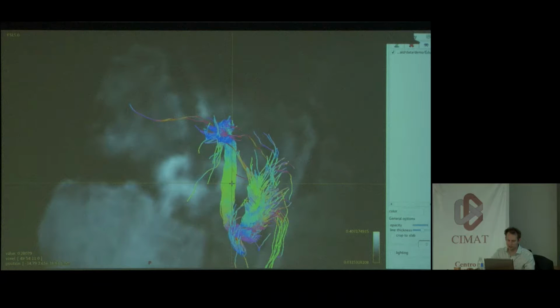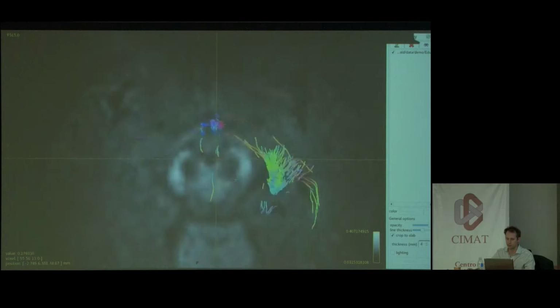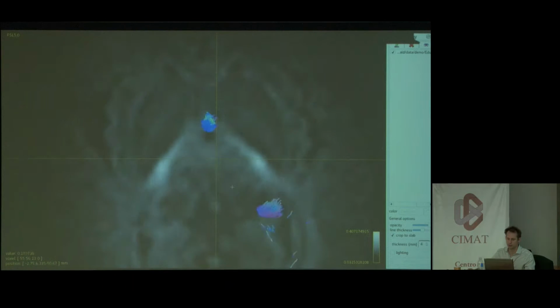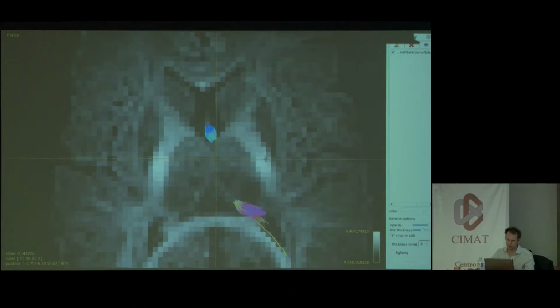So yeah, this is probabilistic tracking. So of course you're going to get things that don't necessarily match with what you'd like, but by and large, it's not a bad way to do it. I notice there's a lot of various slice-to-slice intensity variations.